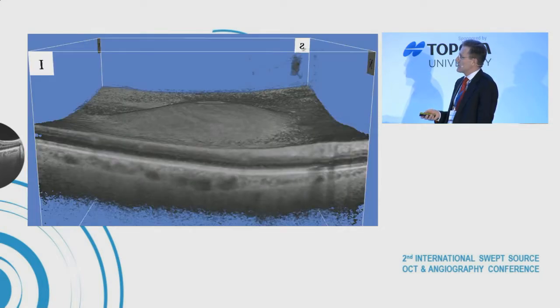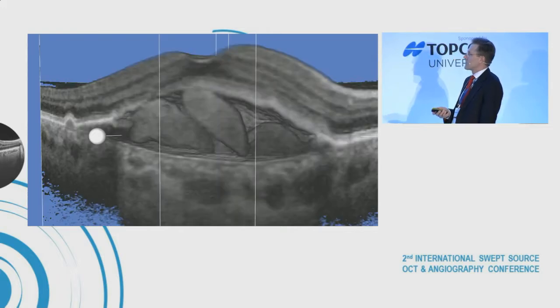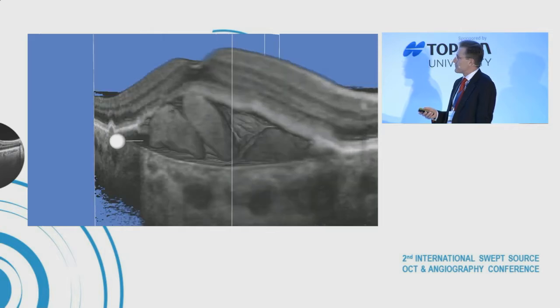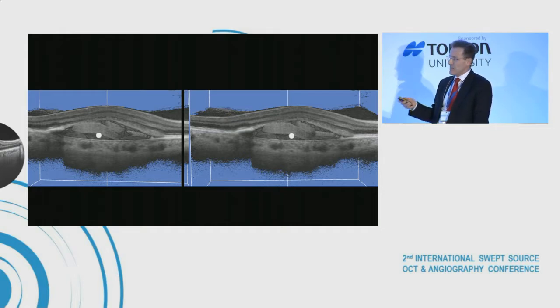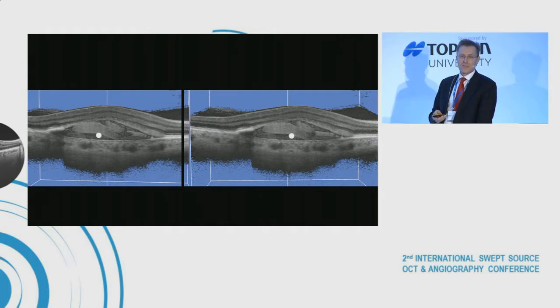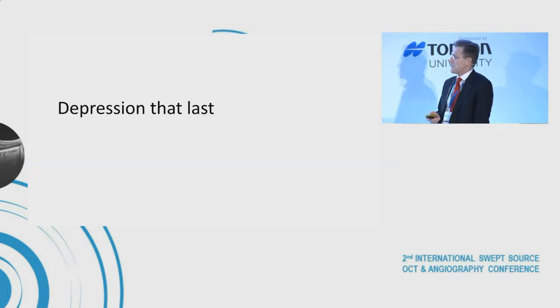And that gives a good stereoscopic impression. But you can get even more stereoscopic impression by producing a rendition in 3D. So if we can get this out at the presentation, then you'll see that if you know how to squint your eyes, you can get a perfect 3D stereoscopic presentation of structures such as these. You can even do that in a film.